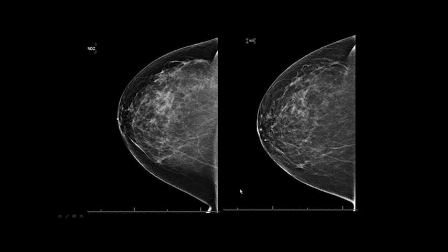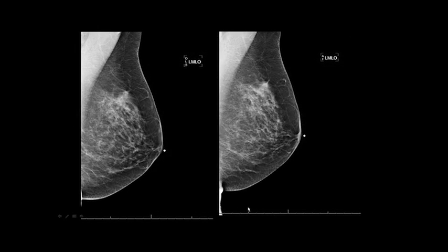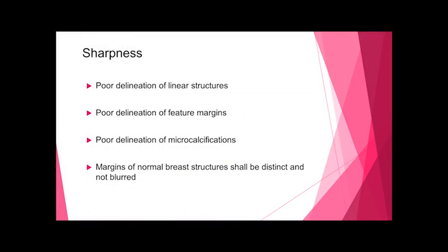It changes everything. Here's another example of good compression and not good compression. Can you tell which side of the same patient, different tech, gave better compression? All right, you can see here it's shadowy, it's summation, it's not compressed as well. It doesn't look sharp compared to here. You could tell that these are more separated anterior than it is here, and the contrast is better. So there are many different factors, as we talked about, for why compression is so very, very important.